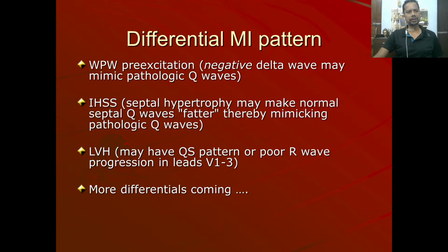Now what all differentials you should keep? Be in the last few slides, so hang around and we'll finish this topic today. So WPW, pre-excitation syndrome with negative delta waves, they may mimic pathological Q waves.